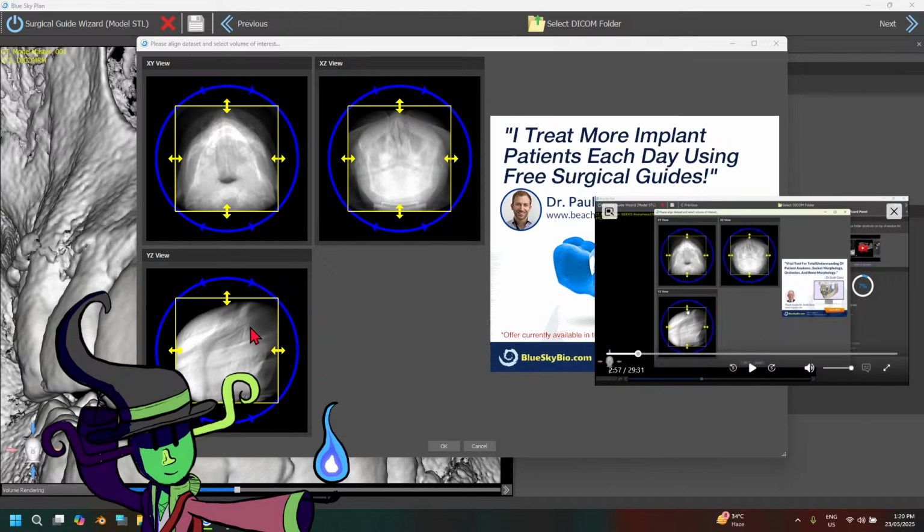How are you making that out? Just so you know, guys, this guy is also using the same files as me, I'm pretty sure, because it's a publicly available CBCT scan that you can download off their site. What do you mean you can make out the socket?